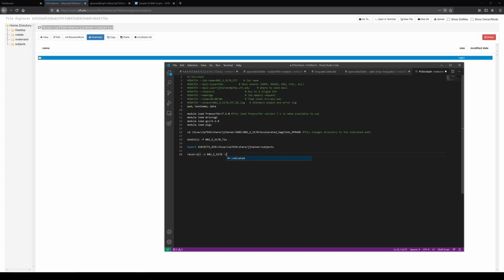And then I'm going to do the input. Now in this case, I'm going to put in this whole path. We are in this directory, so I don't have to do this, but just to be safe, I'm going to do what's called the absolute path. And I'm going to put in that whole path. And then we want to get this output file that we created. So that's our output file, but we have to add .nii.gz. Remember, this file hasn't been created yet. We're just running the script.